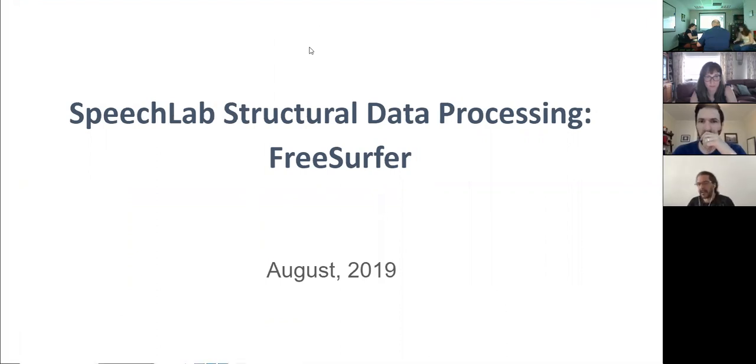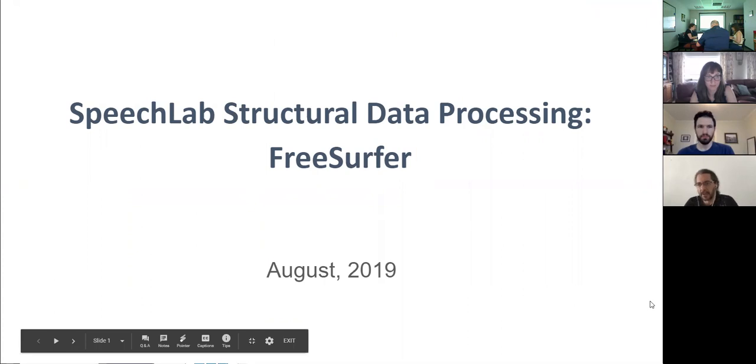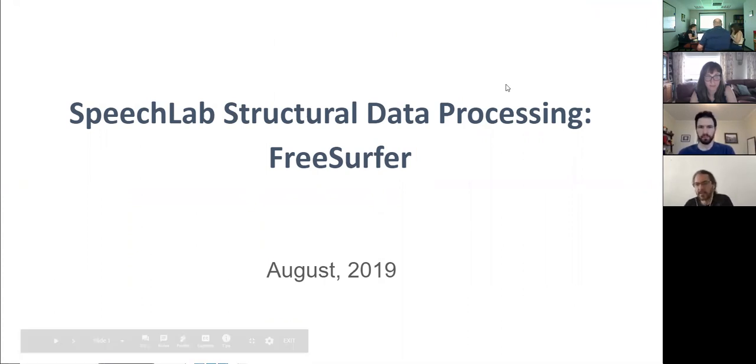Yeah, you can do it through the REX GUI or through the command line. If you do it through the REX GUI, you just have to click on the sources and select the mask file. Then click the ROIs and select the ROI defining file, whatever atlas you are thinking of. And then change the measure, there is a measure that says average or something like that, which typically extracts the average values within the ROI. Change that to the one called count, which is basically going to count the number of values above 0 within each ROI.